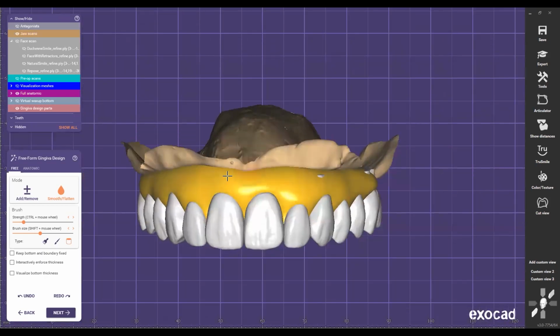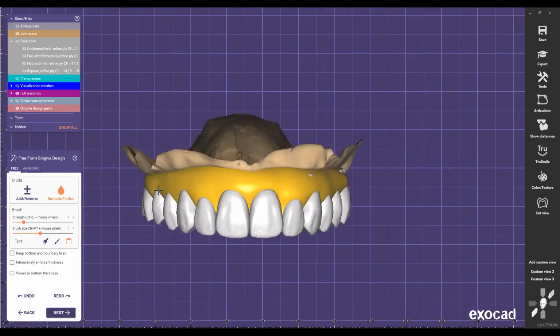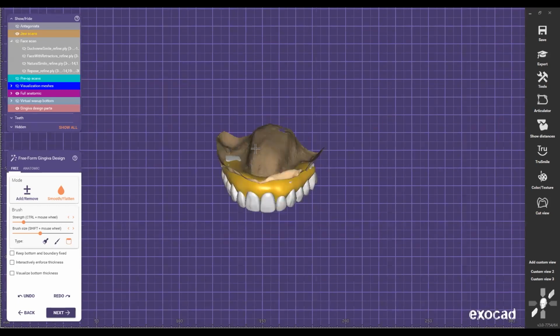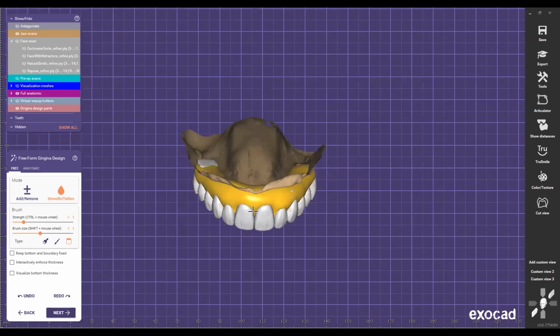We didn't communicate that to the doctor. So now we spend a lot of time on nice characterization of the gingiva when the doctor didn't cut it because they didn't know, right? But if you communicate that information, say, hey doc, I checked the CBCT and we can cut up to here, and you guys are gonna be reviewing that case before surgery as well.